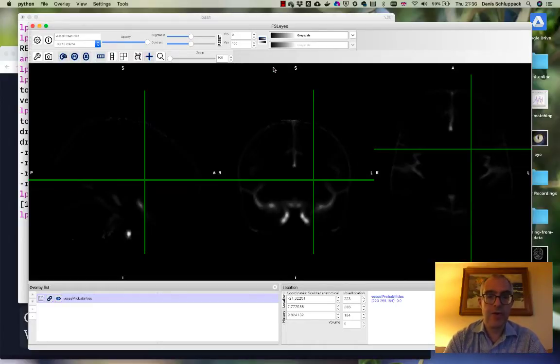Okay, so what do you think is going to happen if I change the number from 0 to 100, say to 0 to 50? I'm going to do the typing, but I'm not going to hit return yet. What do you think is going to happen? Are we going to lose some of these things, or are we going to see more of them? Maybe you can try and think through what you think would happen and rationalize why that might be the case. You might even want to pause the video for a minute here and think about this a little bit more deeply.